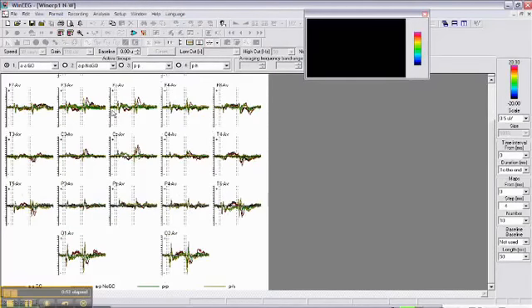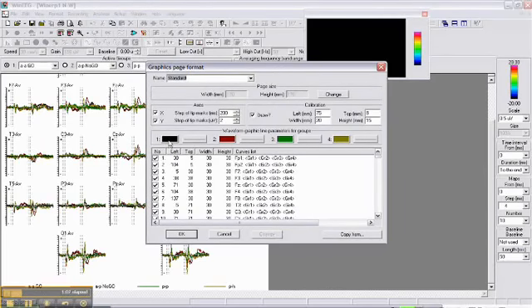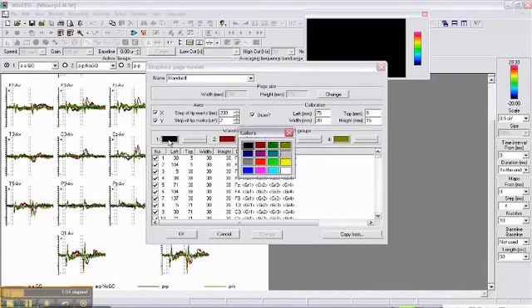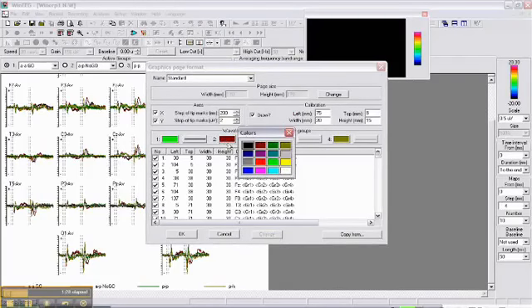Okay, the ERPs are computed. I usually prefer different colors than are seen here. So go to setup and change the colors. Go to setup, graph formats, and select. Say we want the first category of trials to be green, with a thick line.